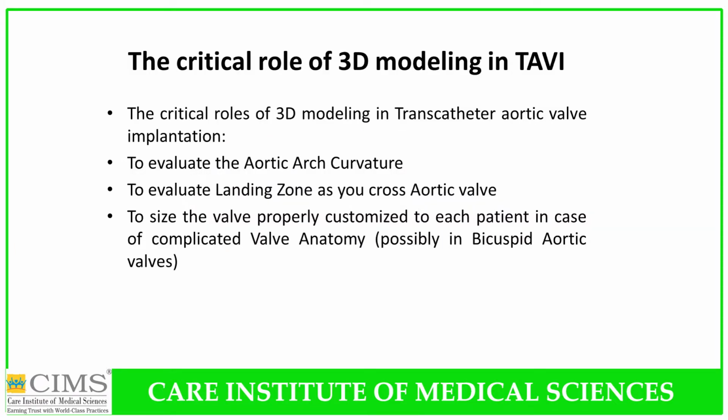The critical role of 3D modeling in TAVI again is to evaluate the aortic arch curvature, evaluate the landing zone, and to size the valve properly, customized to each patient in case of complicated valve anatomy, especially in bicuspid aortic valve, or in case of tortuous aorta, the aortic arch.